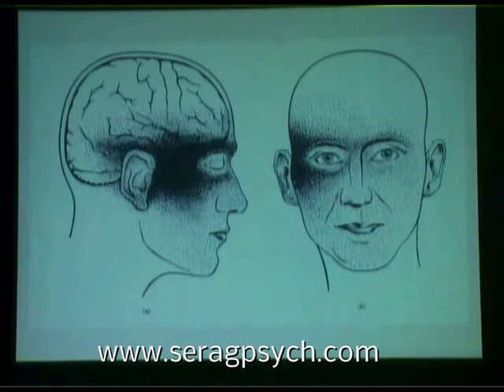And this is Gibbs's picture created in the 1940s based on his field plots of temporal lobe epilepsies in his 8-channel paper EEG, and this is what he came up with. Now you remember the 10-20 system popularized and created by Herbert Jasper in 1958. That's FP2 there, and this is F8 right about here.